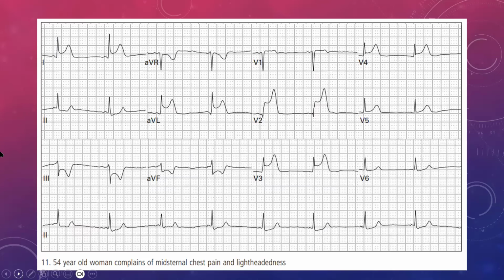Yeah, but otherwise, if it's okay with you guys, then we'll start. So I hope you had a chance to have a look at the ECG that I had posted a bit earlier. If you didn't, it's not a problem because we'll go through it now step by step, and then we'll try and figure out what's going on with our patient. So we have a 54-year-old woman complaining of mid-sternal chest pain and lightheadedness.